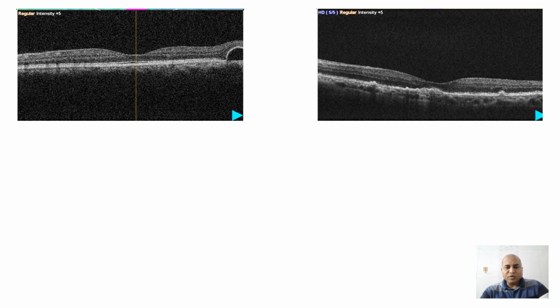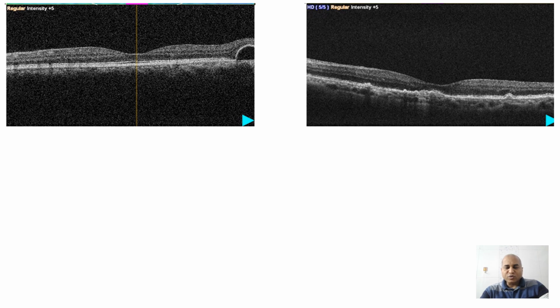I'll show you a few more images just to have an assessment, and this will deal with the disease part as seen on OCT. So here we have 2 similar images in which we can see this part of the image, their layers are split, and same goes on to here where there are multiple such disturbances. Now can you differentiate between these 2 lesions?